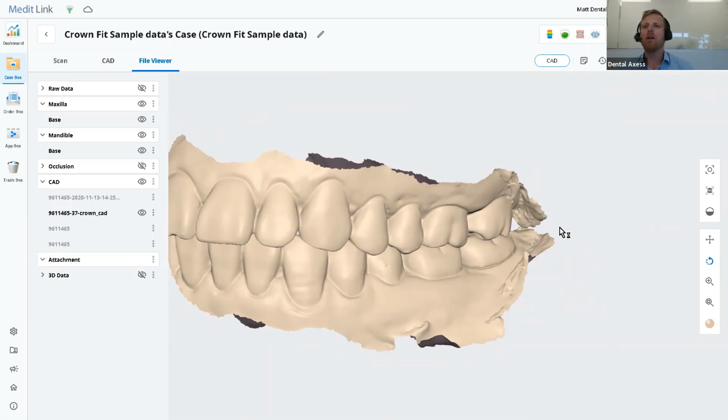So as I spoke about before, the idea of this is to take a design of a crown you've manufactured, whether it's milling or printing, scan the manufactured crown, and then compare it. So some of you may be familiar with a CMM machine. In the case of a CMM machine, that's what you will use for manufacturing in a factory or something, if you ever need to do that. So let me just move this down on the other screen, and then I'll bring it across so you can see. So here we go.